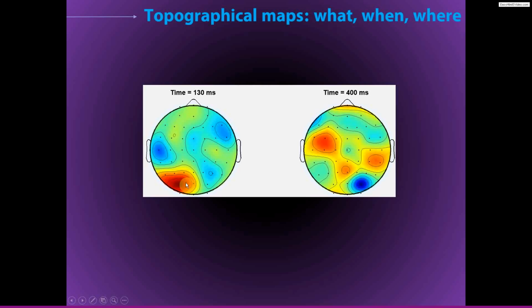This is very useful. For example, if this was the first subject in your pilot experiment that you were testing, and let's say this is supposed to be the condition where there was a stimulus presented on the left side of the screen, now this should raise some alarm bells that perhaps something went wrong with the experiment trigger coding, the labeling of the markers or something. So it provides a bit of a sanity check, looking at these topographical maps.